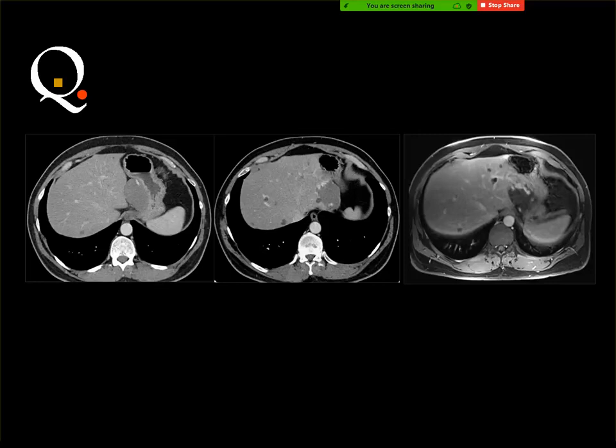Multiple hepatic cystic lesions. Yes, these are benign cysts. Is there any lesion other than benign cysts? I see some small hypoechoic lesions in the liver that look like deposits. No, these are cysts, we agree about. Yes. Cystic metastasis. You see this? Yes. What is this?